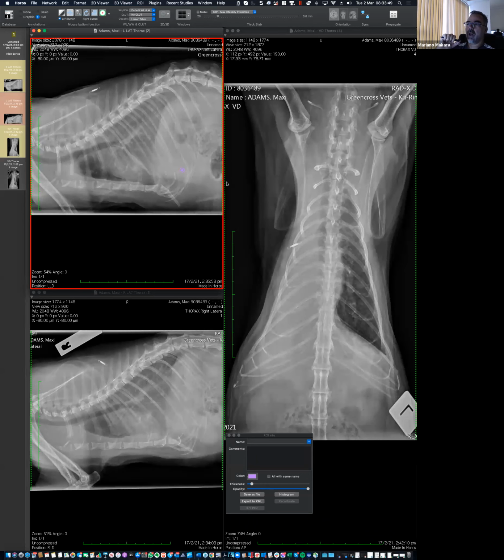I really love how you went on and said, what if the neoplasia is bleeding? And now we have a neoplasia that is bleeding within the lung. And then that lung is all fluid filled, which is the bleeding within that lung. Makes sense? That sounds like a very good option. And that could probably explain why we don't see the classic mass.